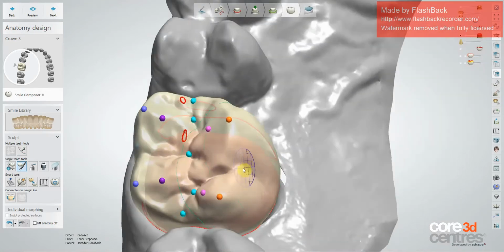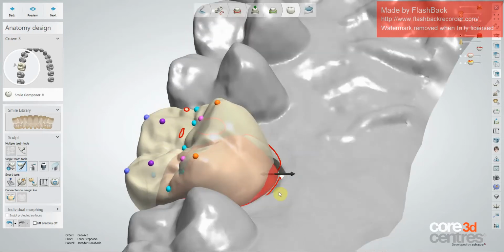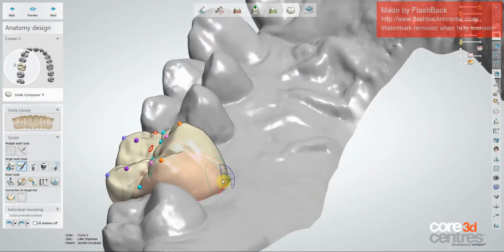Okay, another thing is the circle of influence. I keep it large. Okay, I don't want to come down here. If this is tucked in, I don't want to come in here and start doing this. That's how you make a monster out of something that wasn't. So what I do is shift button, shift and scroll changes the size of that circle.